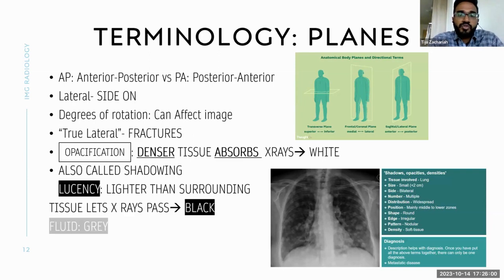Why do we need a true lateral view? Why not just any lateral view? That will be the next question. So the advantage of a true lateral view is, say, for example, a pediatric elbow X-ray, a supracondylar fracture in kids. The first question that comes into the mind of an orthopedic surgeon will be whether he needs to go for a surgical treatment modality or whether he can go in a conservative way.